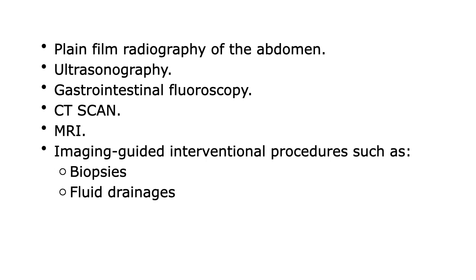So we are going to start, as usual, with knowing the X-rays or radiological studies you can use in the gastrointestinal system. In this case, we have plain X-rays of the abdomen and ultrasound. We also use fluoroscopy, CT scan, MRI, and guided intervention procedures. So let's jump directly to the abdominal X-rays.